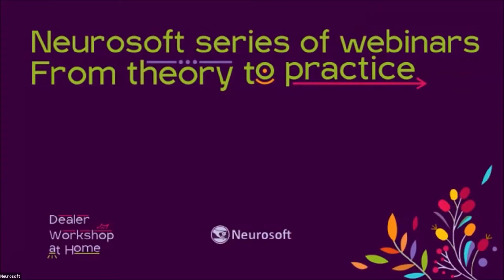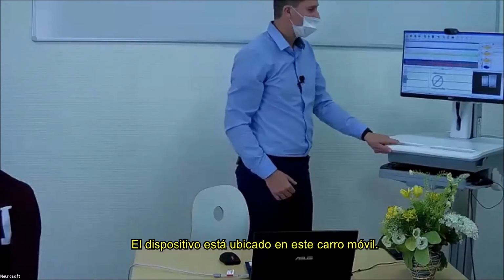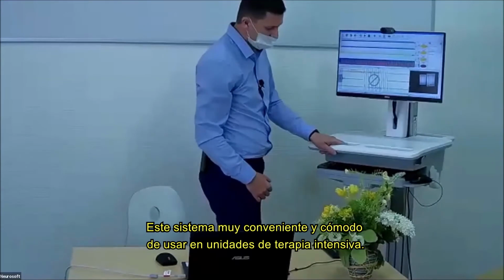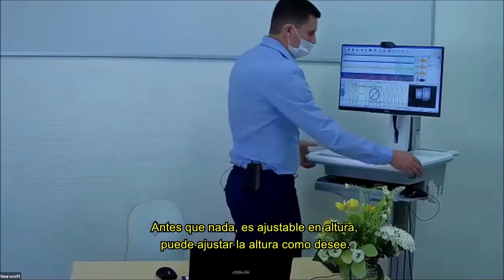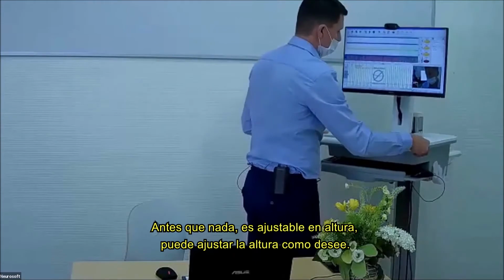Device is located inside this mobile trolley here. And this system is very convenient and comfortable to use in intensive care units. First of all, it is adjustable by height. You can set up height as you wish.